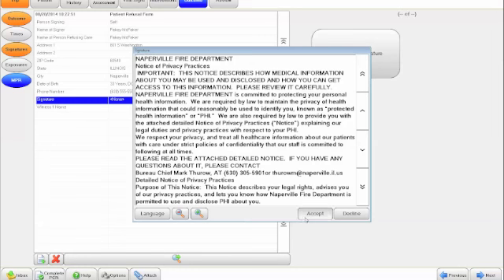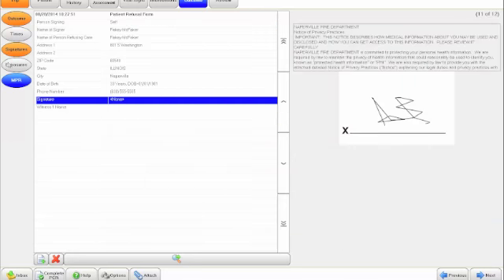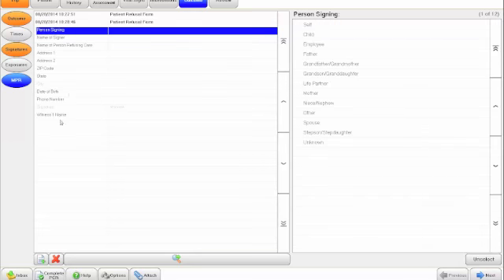And then have them sign. Click down the plus button to add another one, and you can keep stacking them up for as many patients as you need. Now this eliminates the need to add patient care reports for each individual who technically qualifies as an MPR. They're essentially asking for the same information that we had in our old paper forms.